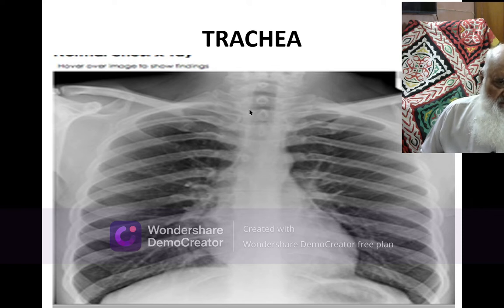If it is more than 10 degrees to the right, it is abnormal. Any degree towards the left is abnormal. It can be displaced to the same side, which means that some pull is exerted on it, for example when the upper lobe of the lung is collapsed.